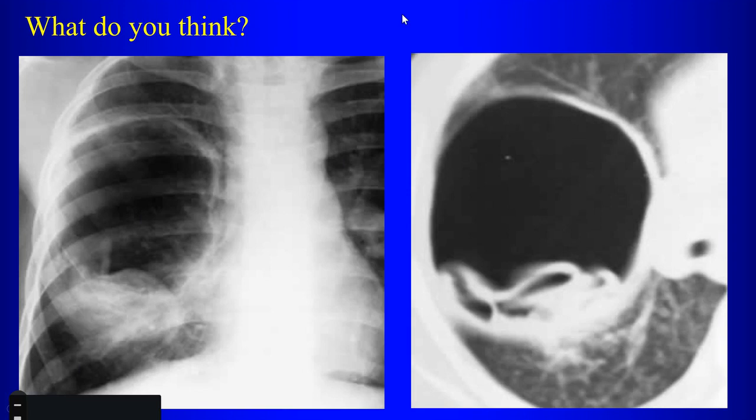The finding here, what do we have? Thick walled cavitary lesion. I don't know about thick wall, but there is a big cavitary lesion, right? But what's peculiar about it? Nodularity of the inferior margin, like linear, curvilinear. Yeah, that is a very strange appearance, isn't it? That you have this thing at the bottom of this cavity. So, what would do this?